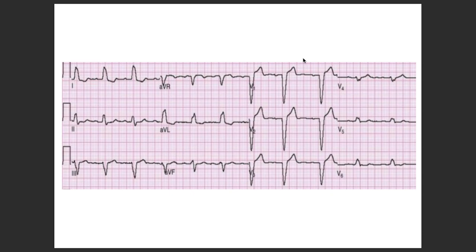Awesome. When you see this ECG, what do you say? It looks like it's a regular rate. Wonderful, this is regular, I agree with you. Regular, and what else? You have the slide as well. 75, yeah, 88 beats per minute or so. Okay, 88 beats. 75. No.